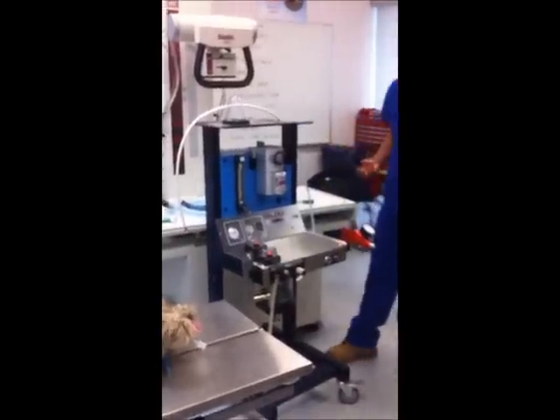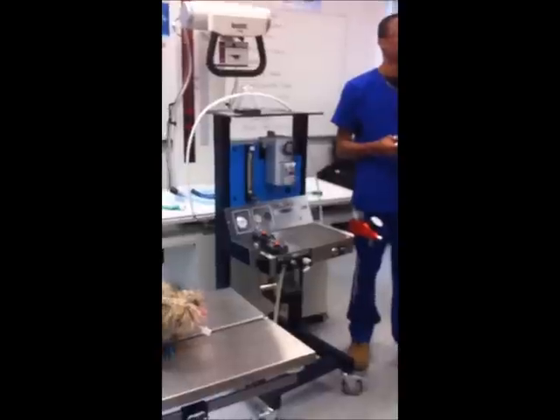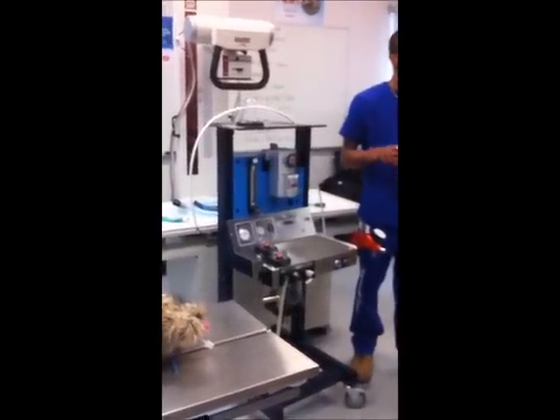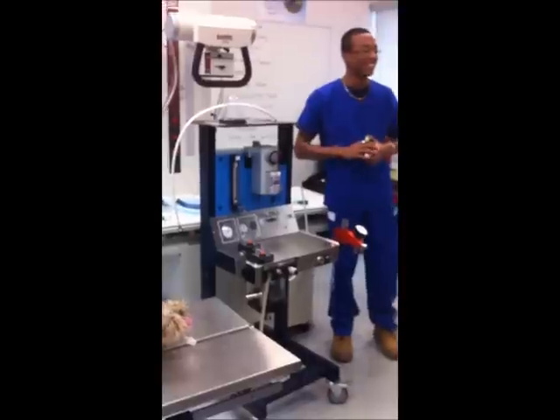How is anesthetic measured? In what unit is anesthetic measured? I'll give you a hint, 2 circles and a line. Percent? Percent. There we go. Genius.